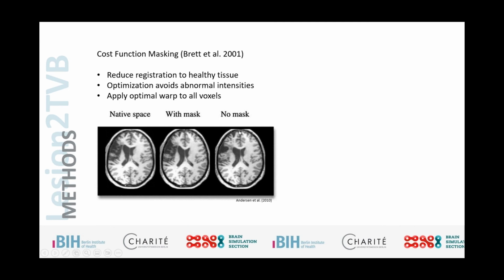So what we end up with if we register to MNI space just normally is something like this, where it's trying to warp this region into the healthy brain of the template, and significantly impacts how the lesion is now represented. We can see, as compared to the original space, it looks nothing like the lesion that we had. So everything that we would do downstream out of this registration step is no longer accurately representing how the lesion actually manifested in this brain.